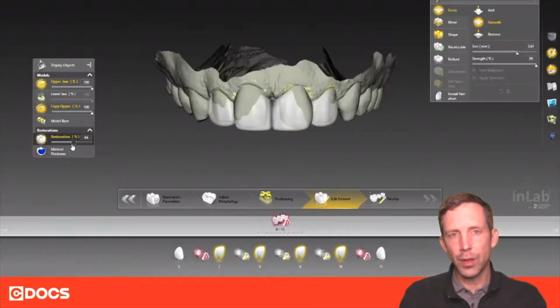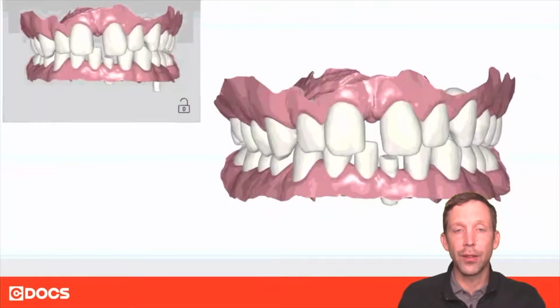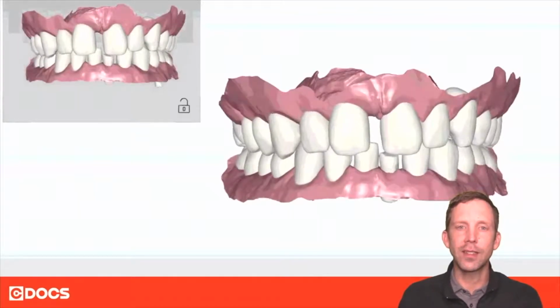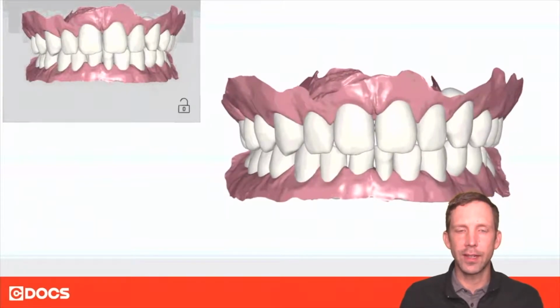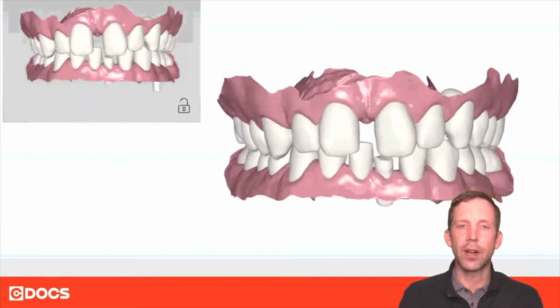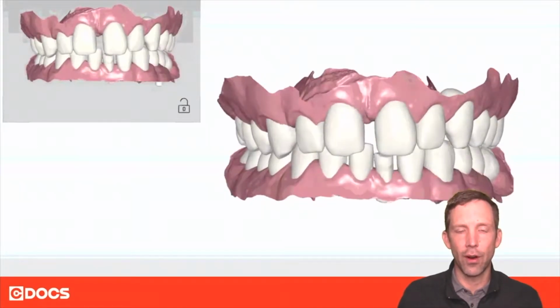Now another thing that we can do with this patient is we can bring the case into the Ortho software. Now the great thing about the Ortho software is it doesn't exactly create perfect simulations, but it creates simulations just to show the patient the value of orthodontic care. Get those teeth in a better position, which will allow us to do more conservative restorations that will look better, last longer, and you'll have to cut the tooth down far less.